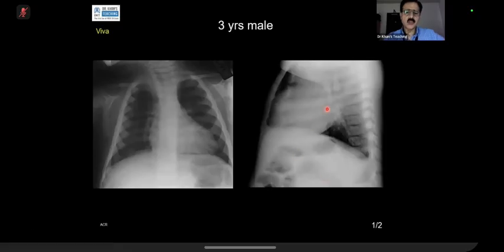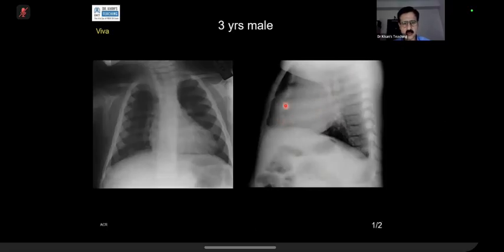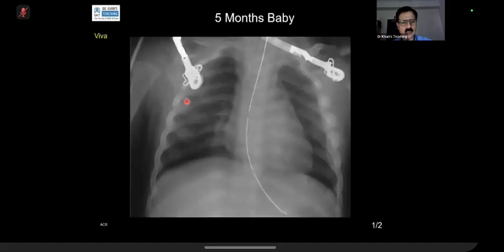Yeah, okay. So please remember this film per se as the first film in your exam. The examiner is going to show you a lateral. And when you get a lateral in the exam, your adrenaline goes up because this generation, your young generation, you don't see laterals. So you start looking, why have the examiner? So actually, this is the costochondral junction, and you can see the same cupping here, and you can see this expansion of the costochondral junction. And the key thing was this line here, which is the costochondral junction equivalent. So this is classical. Over to you.